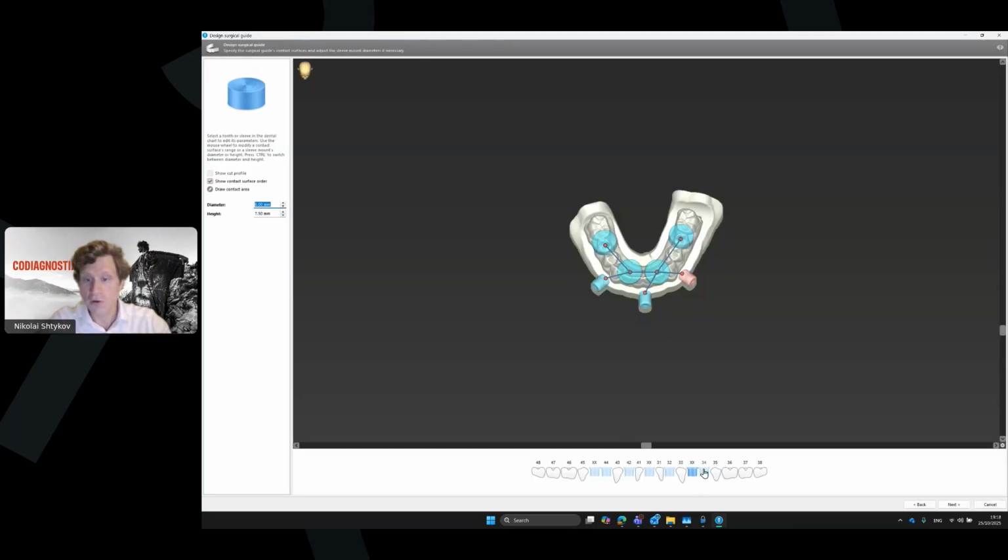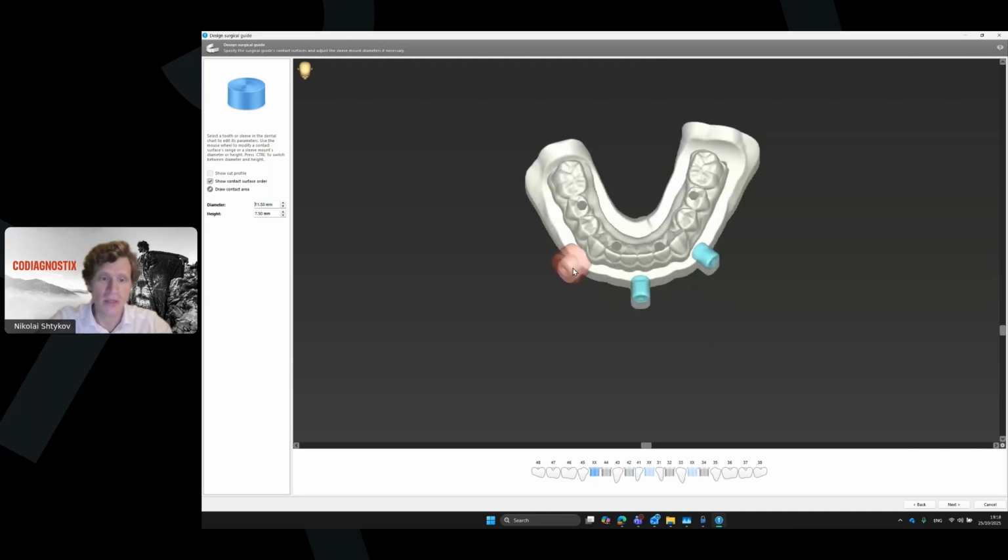And for now, I turn off this. I turn off all of the implants as I have. But I have also pins. And what I prefer to do is extend the width of the pins, maybe 12 will be okay. And then I need to design something here. It's better, I recommend you to start from the middle. So start here and make this area really big.